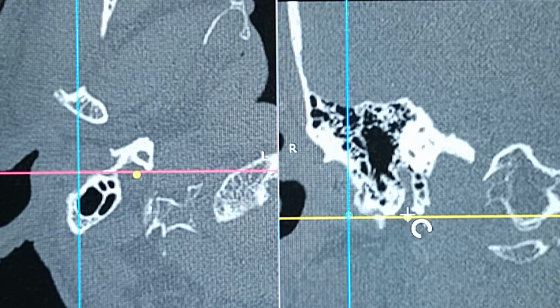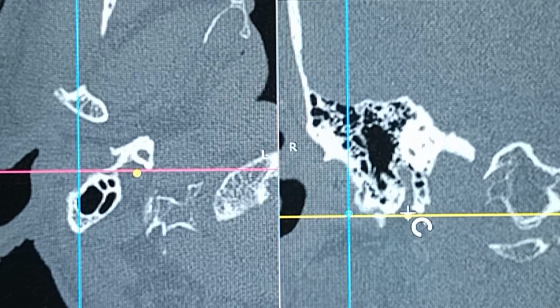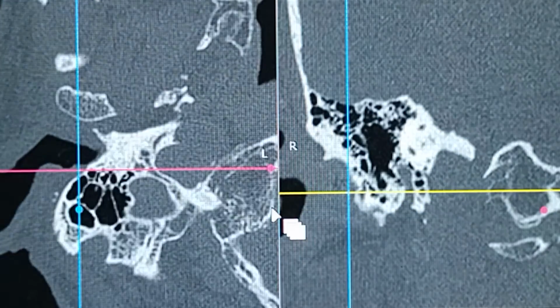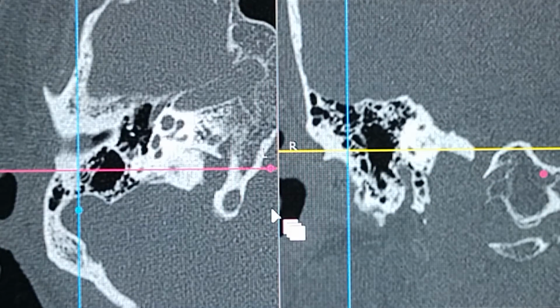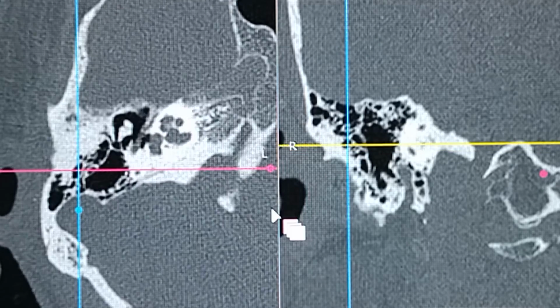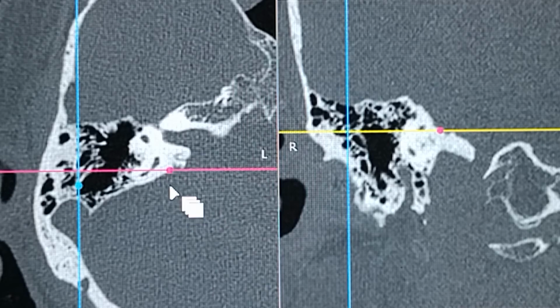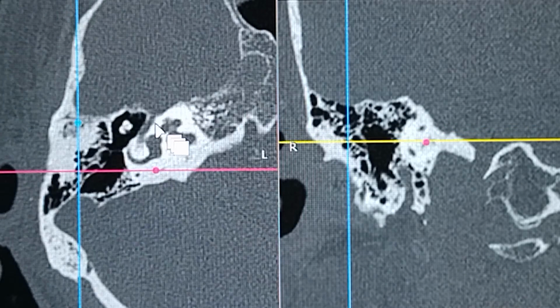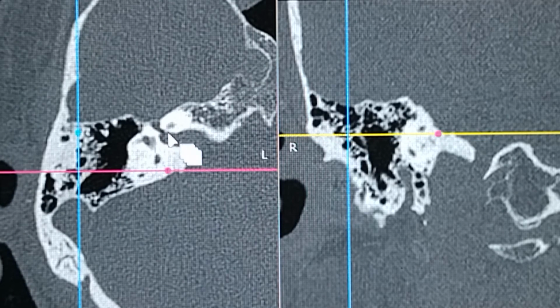So this is how the anterior superior facial nerve is seen, the anterior inferior cochlear nerve is seen, the posterior superior vestibular nerve. Now I was supposed to show you the superior vestibular nerve, which I could not. I showed you the inferior vestibular nerve, which was a very simple head-on finding. But then, okay, what you have to do is just find, this is a geniculate ganglion right there. That's the geniculate ganglion. That's the labyrinthine segment right there.